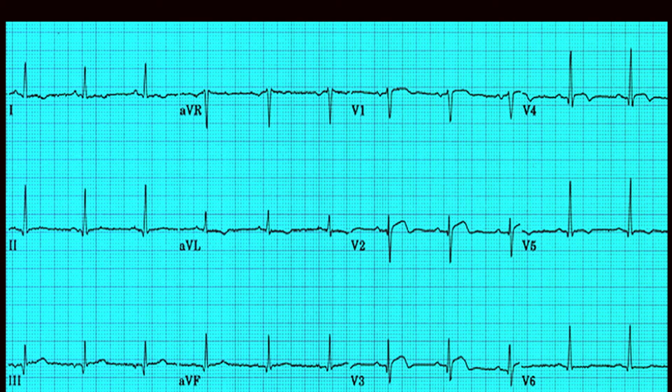So the axis will change again, and these patients might develop left anterior hemiblock, left posterior fascicular block, or LBBB or RBBB, and accordingly the axis will change. So you have to keep this in mind when you comment on the axis change, axis deviation in setting of acute MI. So that's it about this ECG.